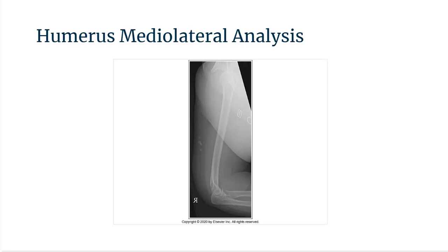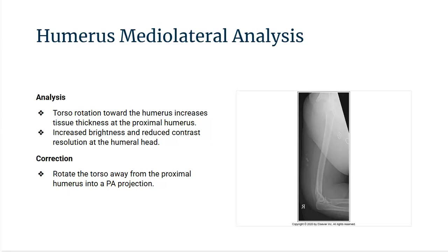Go ahead and review this positioning practice, and we will review it together. Answer the following question. So let's review this positioning practice. For this lateral projection, the patient was placed with their torso in a PA projection.